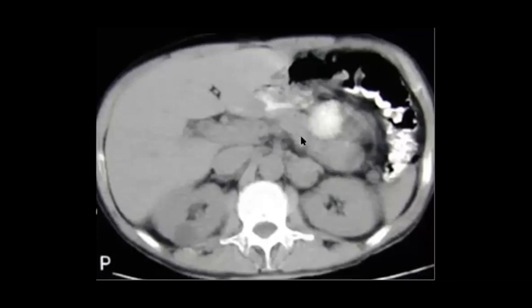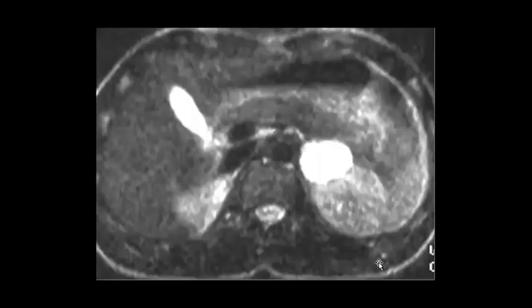So you have a left adrenal mass. Then you will put a differential diagnosis. If I show you this MRI picture, then Nirmin Muhammad, I think now you can see the difference between T1 fat sat and T2 fat sat. So on T2 fat sat, look at anything that has T2 signal, like the CSF, for example, or the gallbladder.